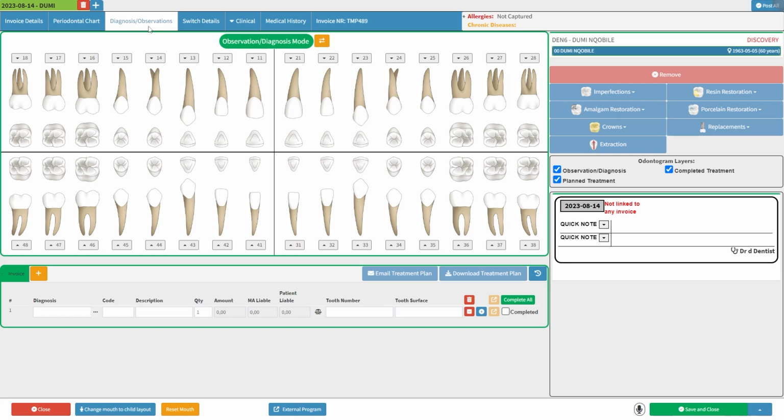The dental chart voice recognition feature embedded within GoodX Web serves as a highly convenient tool, enabling hands-free control through voice commands. In practical terms, dental professionals can seamlessly proceed with their patient-related tasks while utilizing spoken commands to input vital information into the system. We will now take a look at some examples that dentists can utilize with the voice recognition.